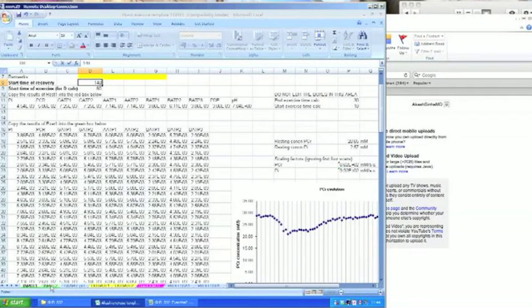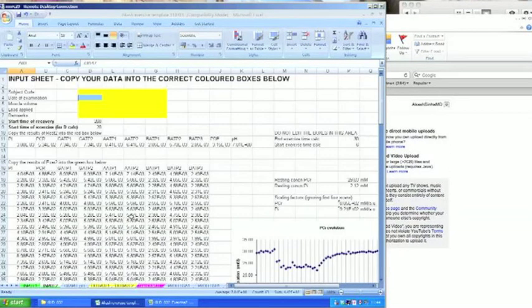And then I go to input 2, and now this is a bit messier. You can see the baseline of the PCR, and then it suddenly drops down there, and then it goes up a bit here. I'll probably say this is 80. I probably need to check this with Kieran. And then this is the point of exercise recovery, which is T.